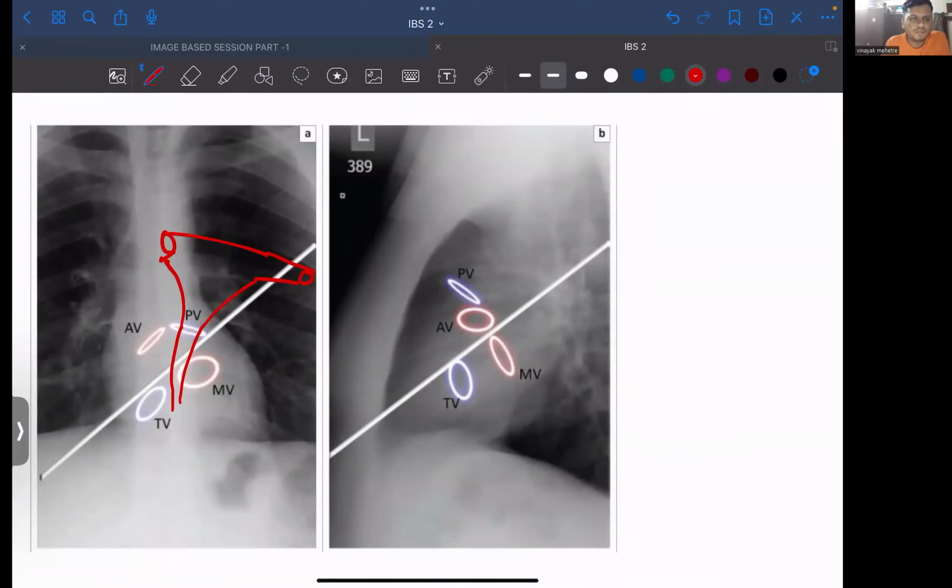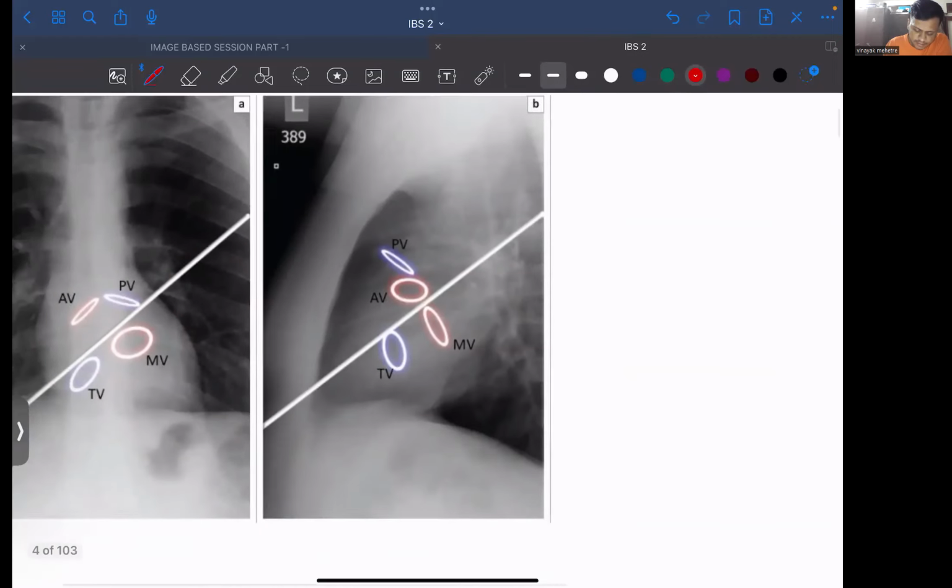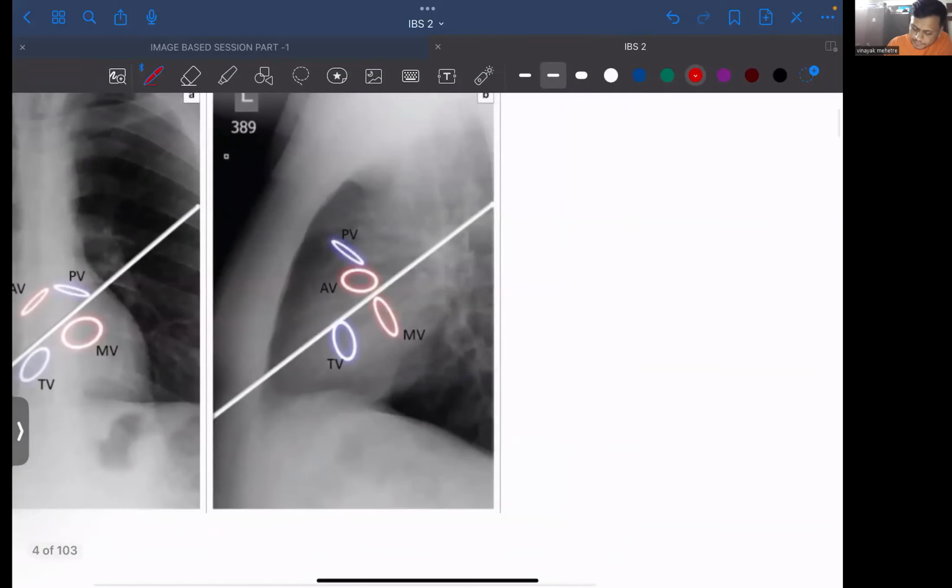Right? Pulmonary valve. In between atria and ventricle, what do we have? Tricuspid valve, right? Kind of like this. So it will be the tricuspid valve. The aorta opens from the left side, so it is the aortic valve, right? So remember it like this: PAMT.